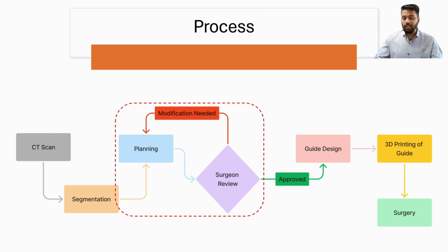So we have the 3D Surgical platform, where we are focusing on this process. If you want to do the planning, share that planning, or do the modification, it will take very little time, and I can show you how much time it takes for the first planning, and also for the modification. So let's jump onto our platform, where I can demonstrate this planning process.